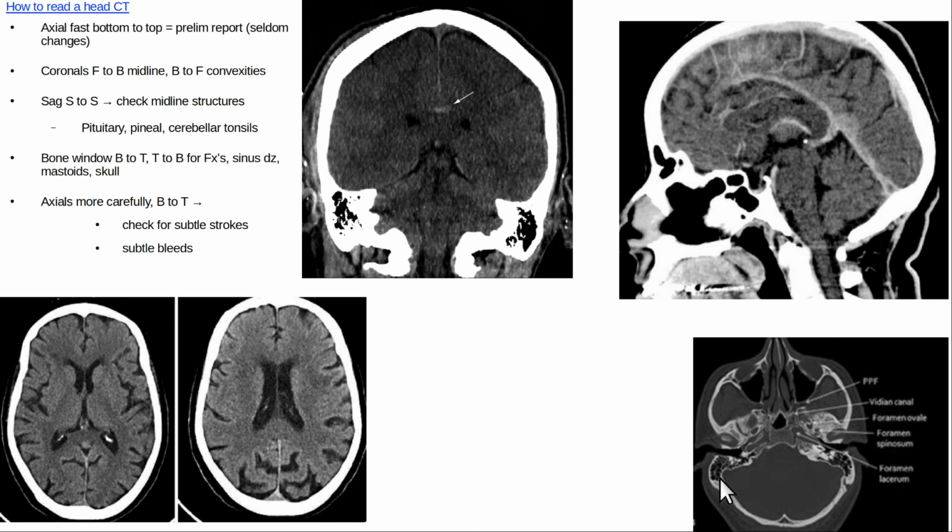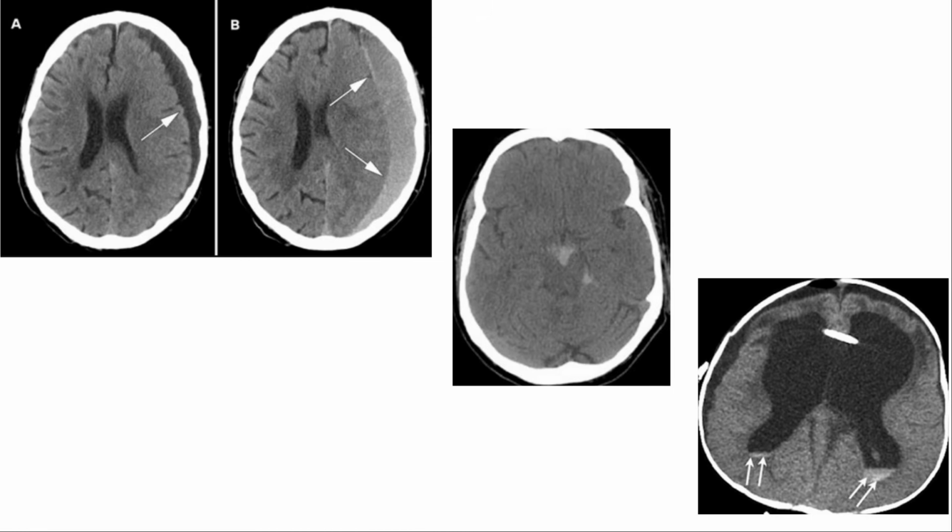Mastoid fluid is usually irrelevant, but we look at it. It's usually incidental trapped fluid. If there were complete opacification of the mastoid on one side, then I would check the nasopharynx to see if there's obstruction of the eustachian tube. That's a typical boards question, by the way.